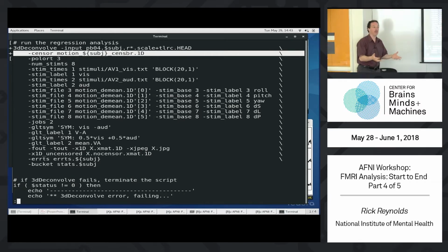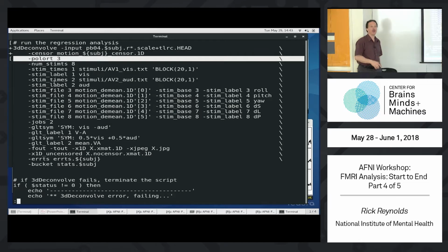Let's review the full model that we're creating here, so that we will censor from. So we use Polort 3. The runs here are 450 seconds long. I'm sorry, not 450 seconds. It's 150 time points. TR of 2, it's 300 seconds. And that's right where it jumps up from 2 to 3.